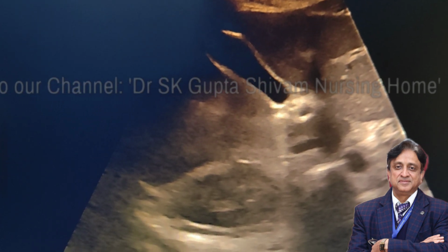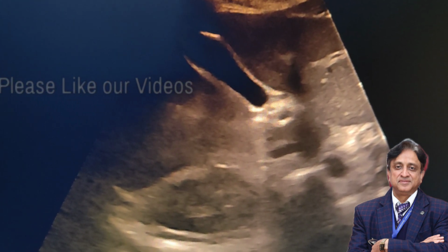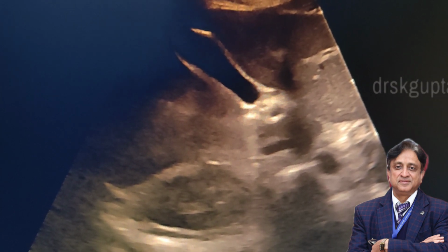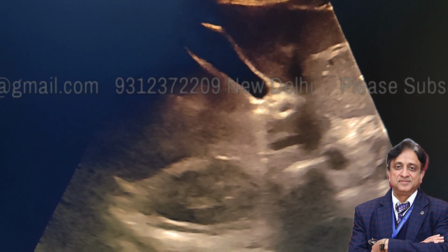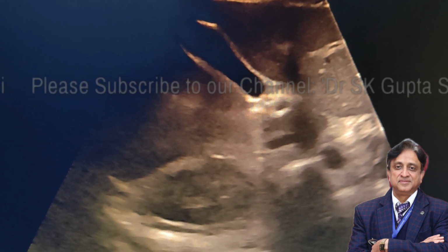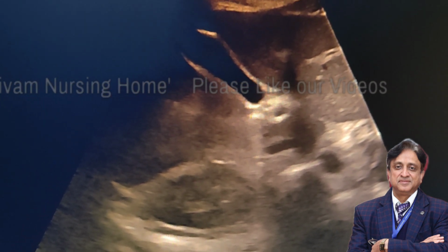These patients should be investigated by way of urine pregnancy test and specifically by the beta HCG levels in the blood. Beta HCG levels in the blood more than 2000 suggest that this patient is having a pregnancy, and this pregnancy has probably ruptured. About 70% specificity and about 67% sensitivity is there for the complex fluid around the uterus.